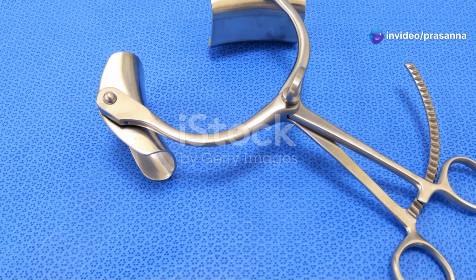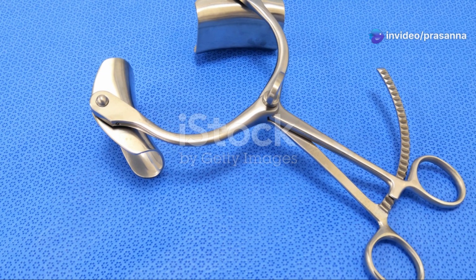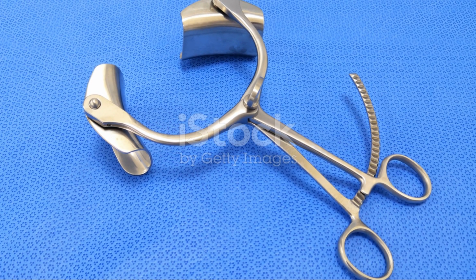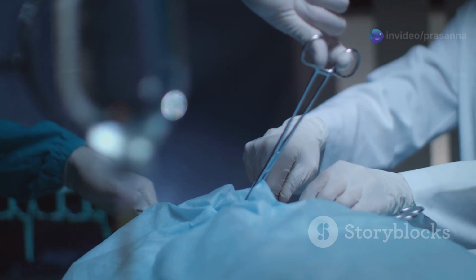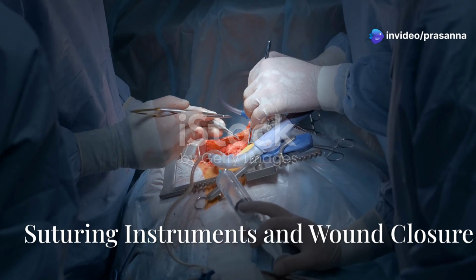Self-retaining retractors, such as the Weitlaner retractor, have a locking mechanism that keeps them in place, freeing up the surgical assistant's hands for other tasks. These retractors are like adjustable clamps, holding tissues apart to create a clear working space for the surgeon.